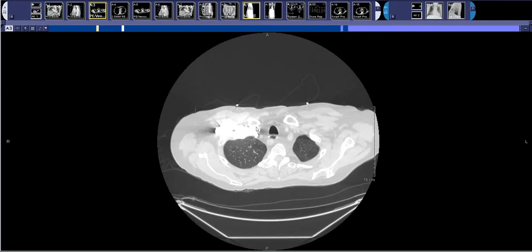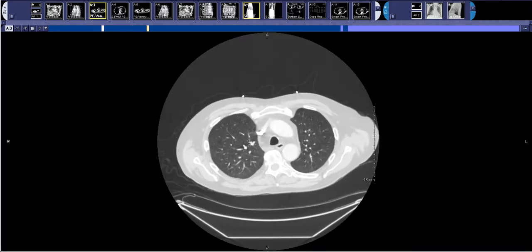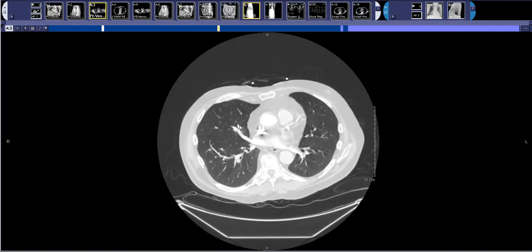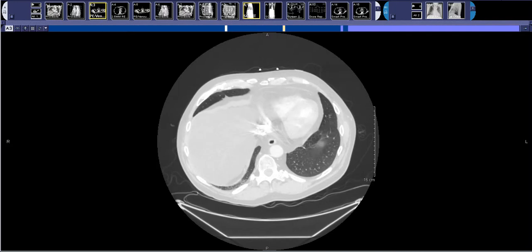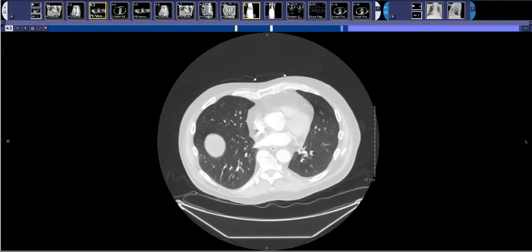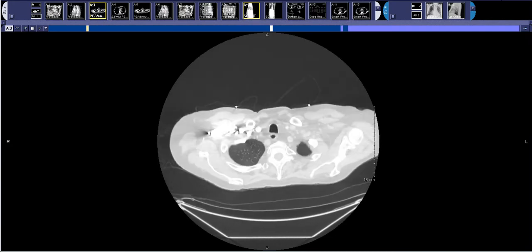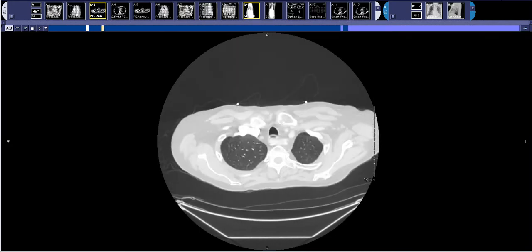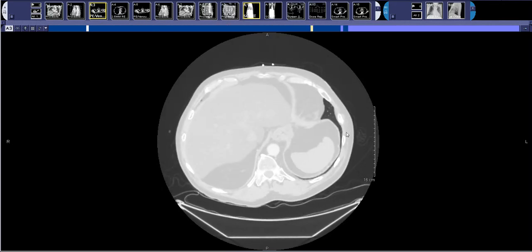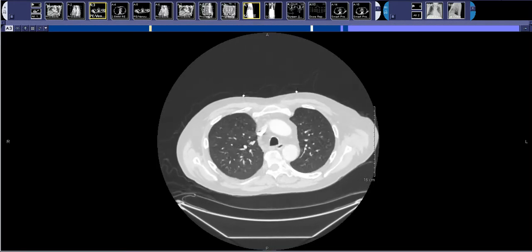The first time I look at the anterior right upper lobe, and I scroll down just looking for any nodules. Usually that's going to be the right upper lobe and right middle lobe that I'm looking at that point. And then I go through the lower lobe on the way up. Then I'll switch to the other side, and I'll do the anterior left upper lobe, come down, and then I'll do the left lower lobe, or posterior left lung, on the way up.